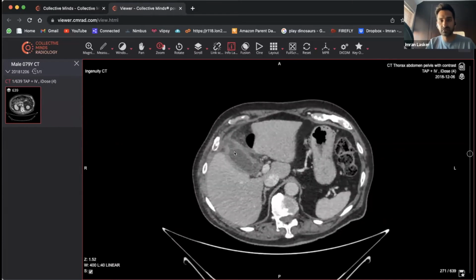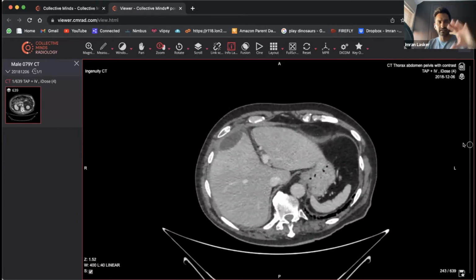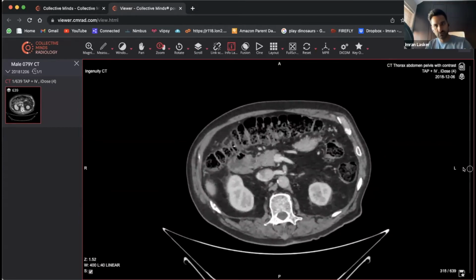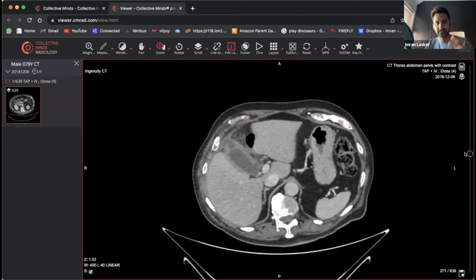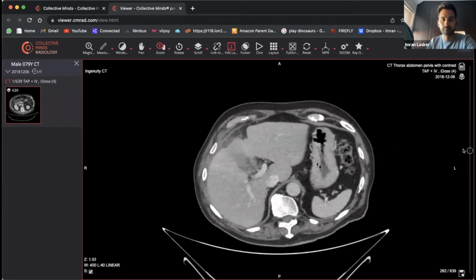And now when you scroll through, you can see, look, gallbladder, maybe with a tract there going that way, and then almost continuing into that kind of collection. And it's very unlikely that that's going to be a bit of thin-walled gallbladder and thick-walled gallbladder. This is almost definitely going to be a collection as a result of a perforation of the gallbladder.